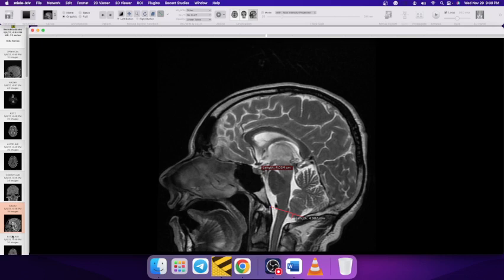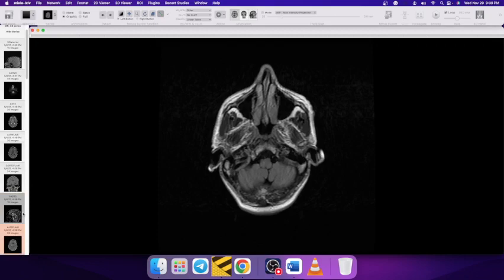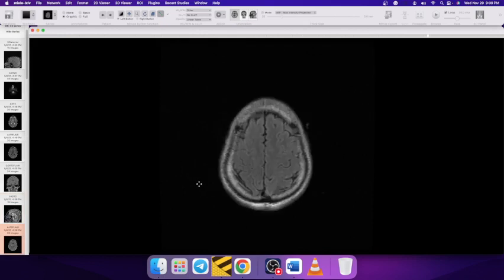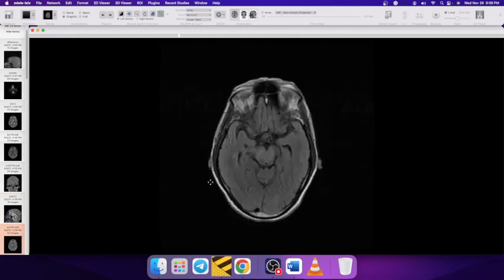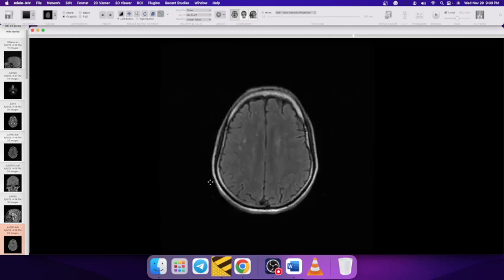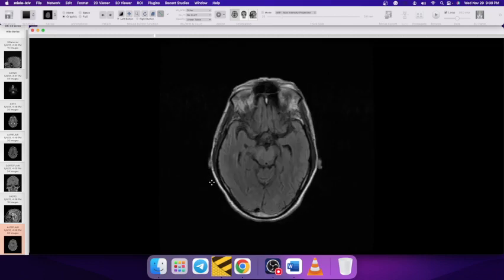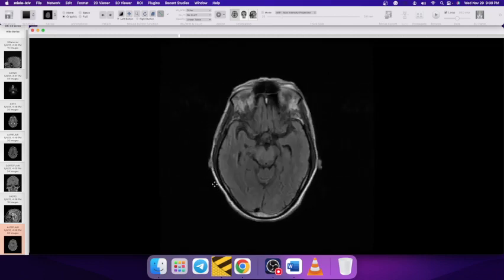Beyond 5, we'll call it tonsillar herniation, but definitely something worth mentioning in your report, that you have at least seen and identified it. Always try to mention everything in the body of the report, at least if not in the impression, whatever you see. That's the rule. Do not leave out anything that's borderline or just prominent or maybe normal variant.